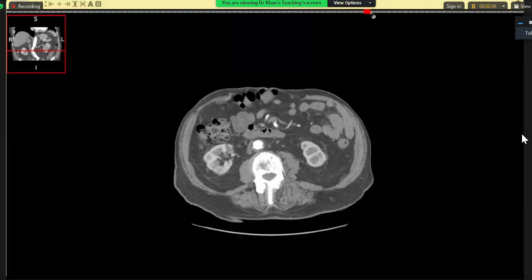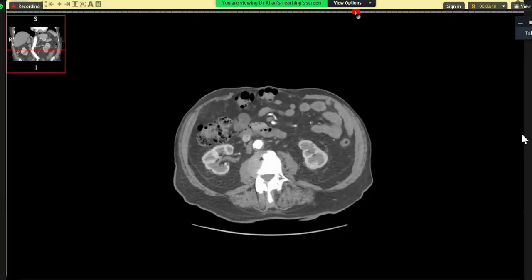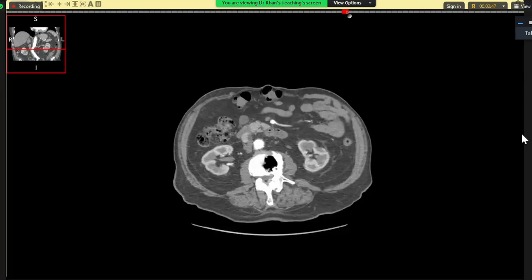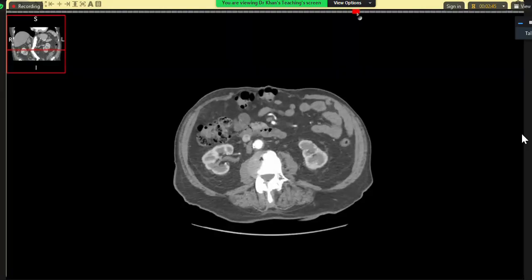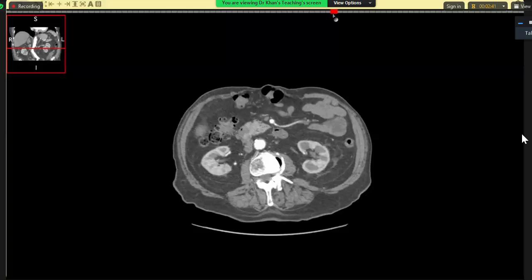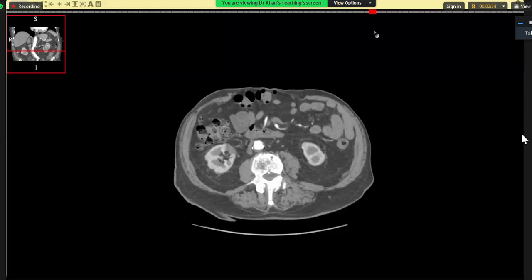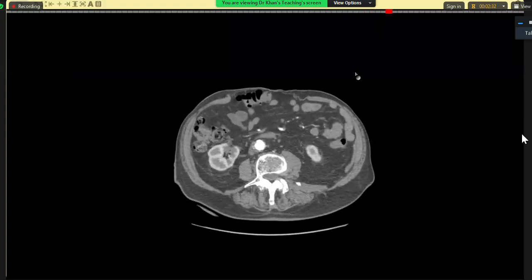Where is the enhancing lesion in the duodenum? Here, this one. Can you see my pointer, doctor? Is it in the duodenum? It's extraluminal, but adjacent to the, I think this. Adjacent to the duodenum. Okay. I will check going down. That's fine. So you have picked up two findings. What is your conclusion?